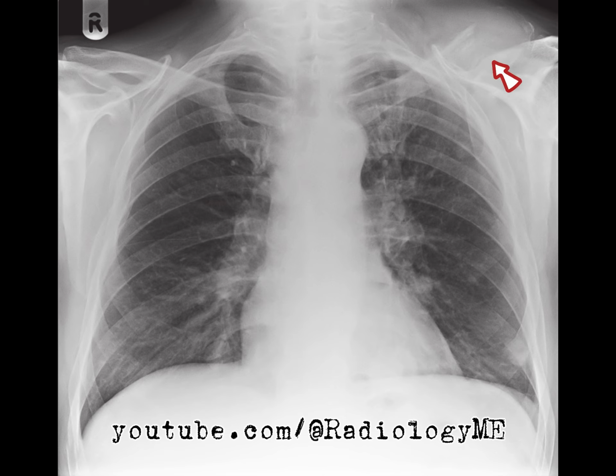One other key finding is the bony destruction of the lateral aspect of the left clavicle. This destruction is pretty substantial, and it's extending into the soft tissues. There's disruption of the fat planes in the supraclavicular fossa, which suggests that there's likely a soft tissue mass component here. There are no other obvious bony destructive lesions that I can see, though I do spot old right-sided rib fractures.